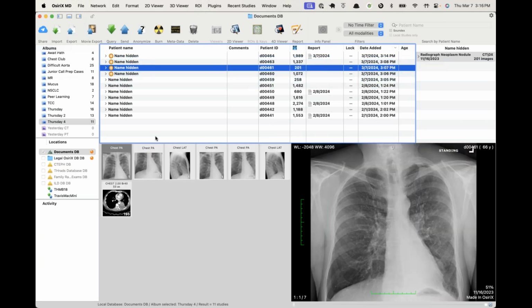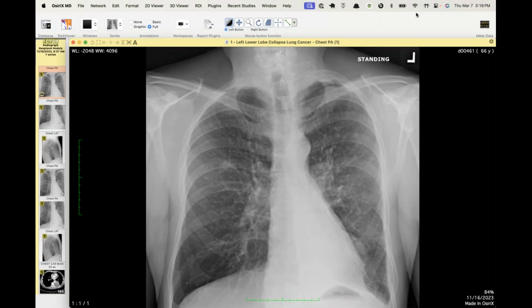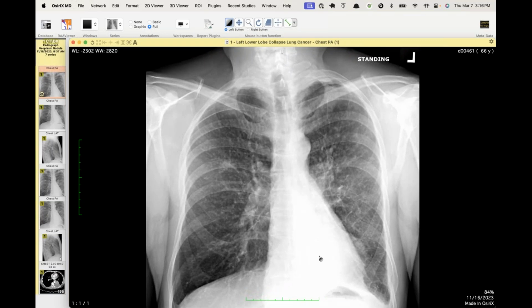So I'll start with this one since Howard just showed one. You should be able to see a radiograph. Yeah, this is another one on the outside, not detected prospectively in the community, but similar to what Howard was saying, hopefully this jumps out now as left lower lobe atelectasis. You can see there's volume loss in the left hemithorax. You get more of the flat waist sign with the straightening of the left mediastinal borders as the heart rotates relative to the volume loss.